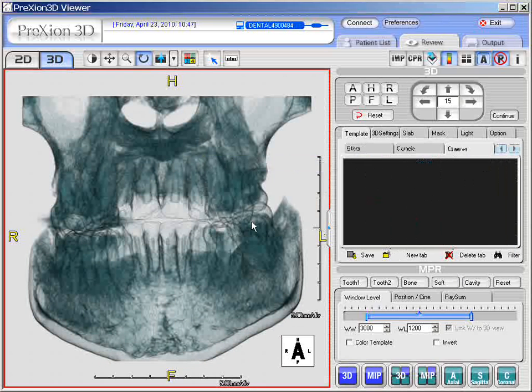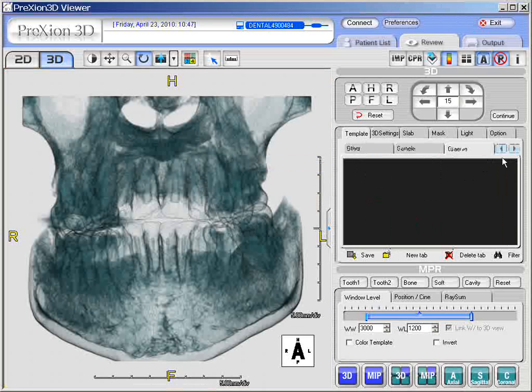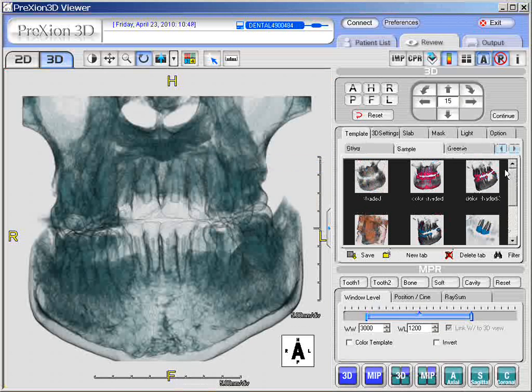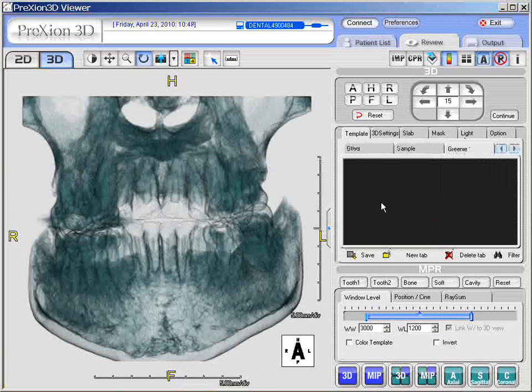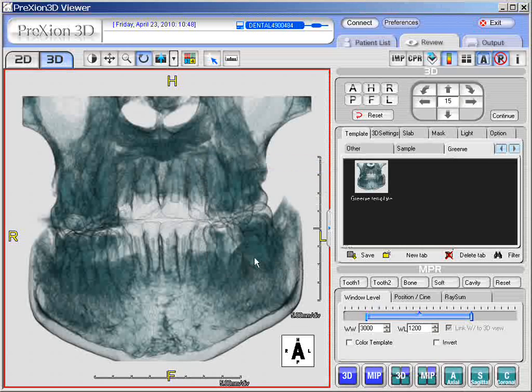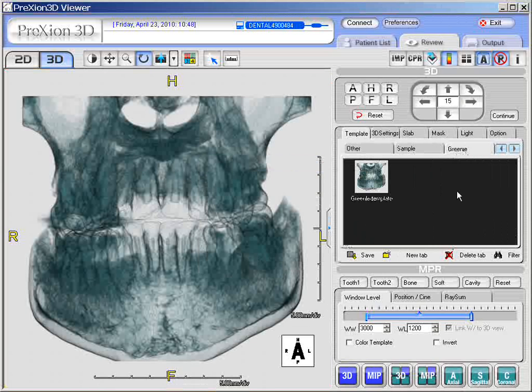Okay, and then click OK, and then that will be your new tab, or you can have it in the sample that you can select. So it's pretty simple. Actually, I created a new tab. What I need to do is save a template. So I'll just save it as a template. Whatever you want to call it is just fine. Okay, and so now I clicked OK. All right, and so here we have on the sample one, I have a new tab, and I've created this.